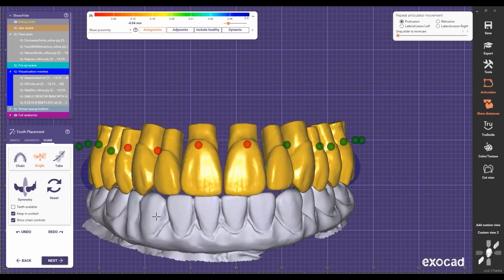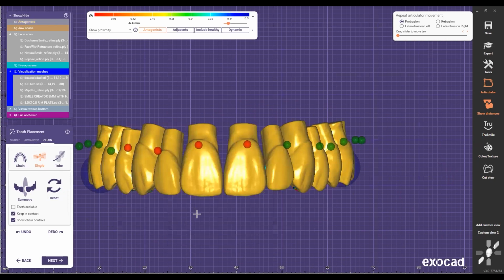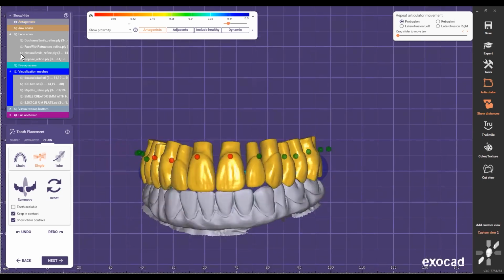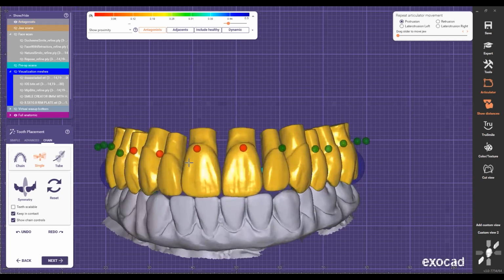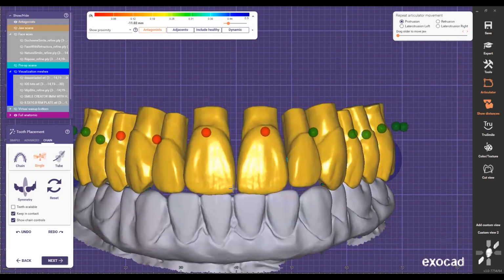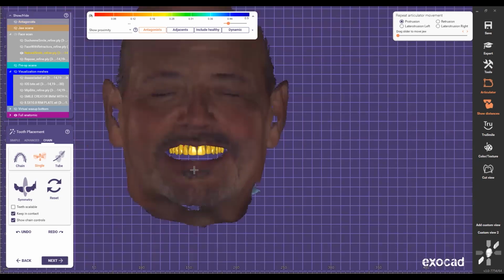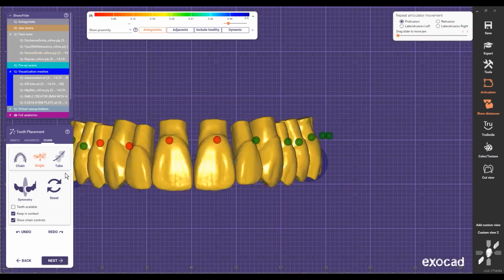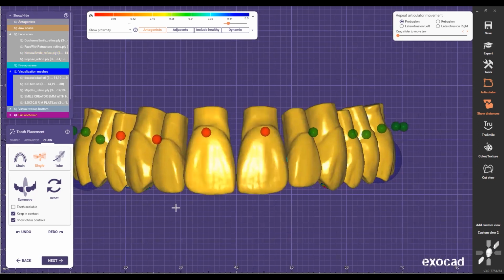Okay, perfect, it looks good. And I just leave it there. So now the right side is fixed, right? Once I do this, now I can see that if it looks good in the face, it's gonna look good in the patient's mouth, okay? So now I can say, okay, now from 8 to the molar right there is already fixed.